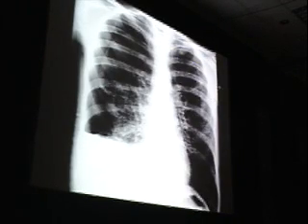Now we begin to move into diseases that should be known to all radiologists, although are not as widely known to others practicing medicine. And in front of you is a disease that's endemic probably in Louisville. Seem to encounter it not infrequently there. Although I would tell you that if you're not in Louisville and you miss every one of these that you ever see, you won't have missed that many cases. But you should know it if you happen to be passing through Louisville. So it comes up. This is lymphangiomyomatosis.